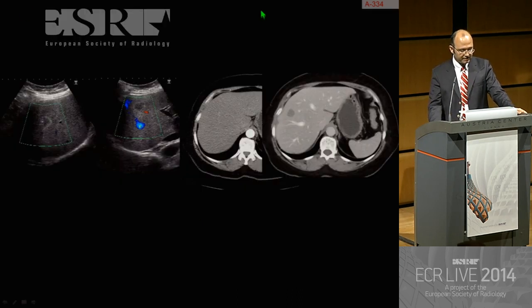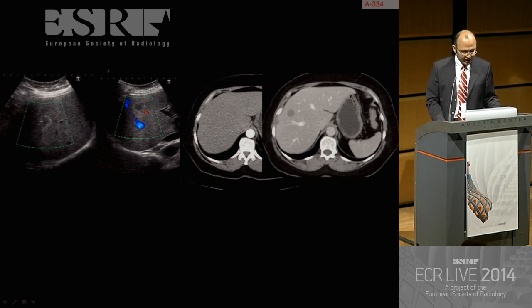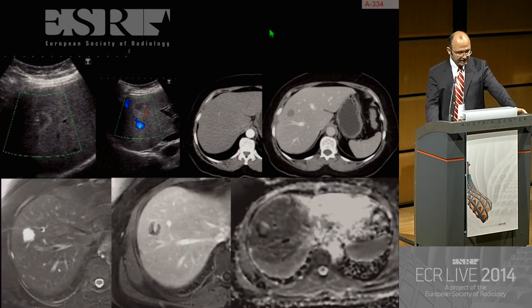And look at this one, another interesting one, hyperechogenic rim, CT. You're kind of puzzled. When you do the MR, it is T2 very bright. You see the shine through effect, and there is bright dot sign.